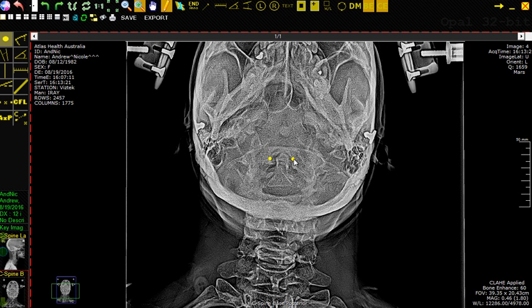Second point that we need to identify, so if this is anterior point 1, in this case this is the left side, this is the right side, we have to find a posterior point 1. And that is the intersection, again, between the skull, where it meets the most lateral aspect of the arch. It's approximately here on this person, and it's approximately here on this person. And so we have anterior point 1 and posterior point 1.